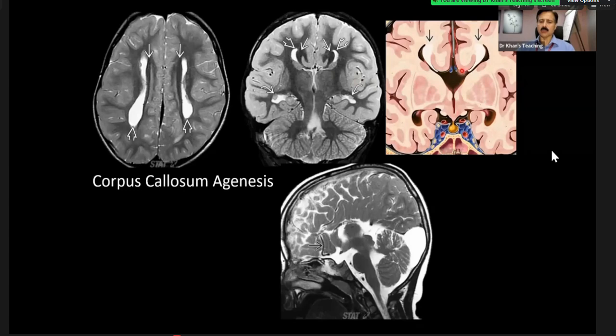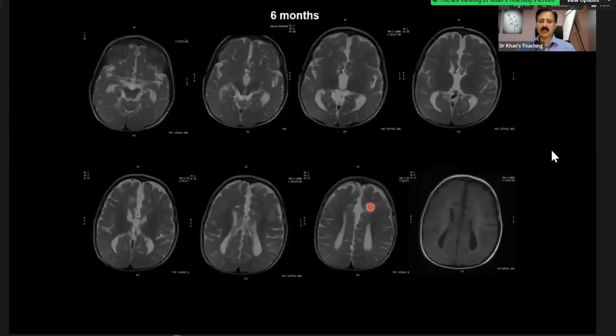So this is corpus callosum, which is absent, and these are known as Probst bundles. These are longitudinally oriented white matter that just go in. So there is upward displacement of the third ventricle, and this is that moose head or Viking head appearance, which you can also see here, but nobody is going to show you. You have to develop your eyes on an axial slice. Nobody is going to show you a sagittal, but you can ask for a sagittal once you pick up on an axial. And if you see here, these were parallel.